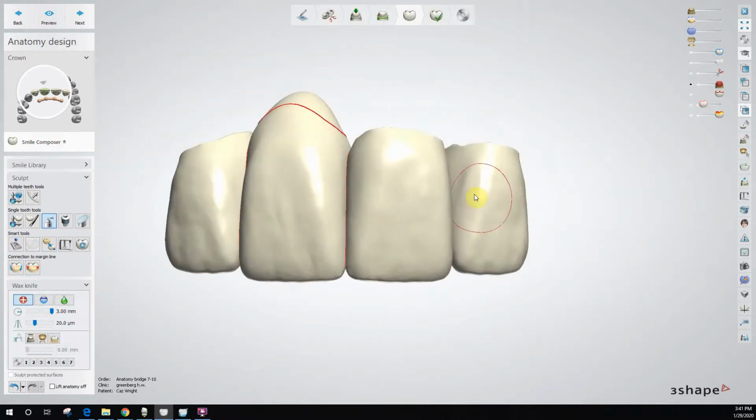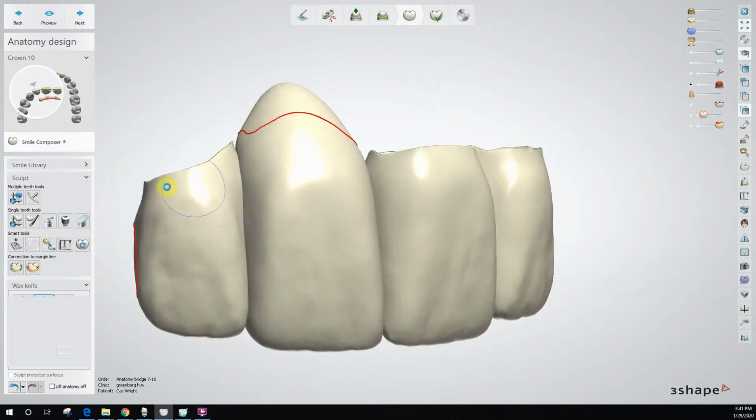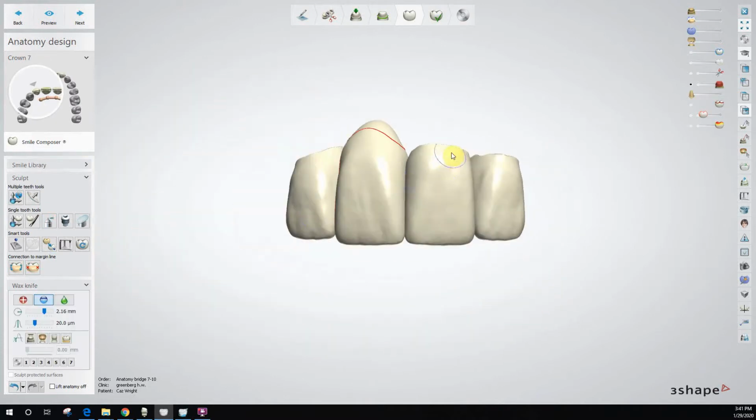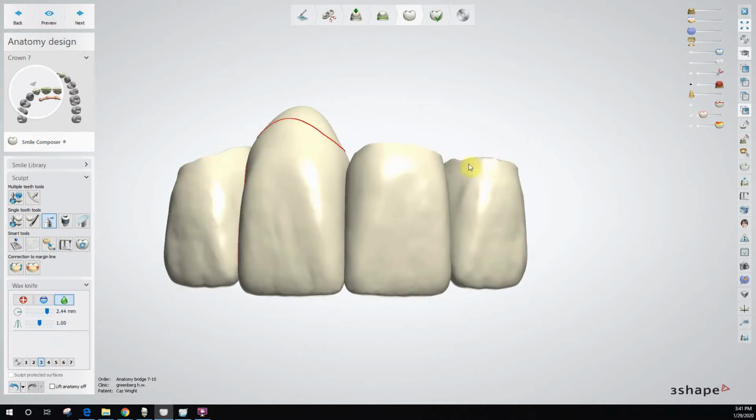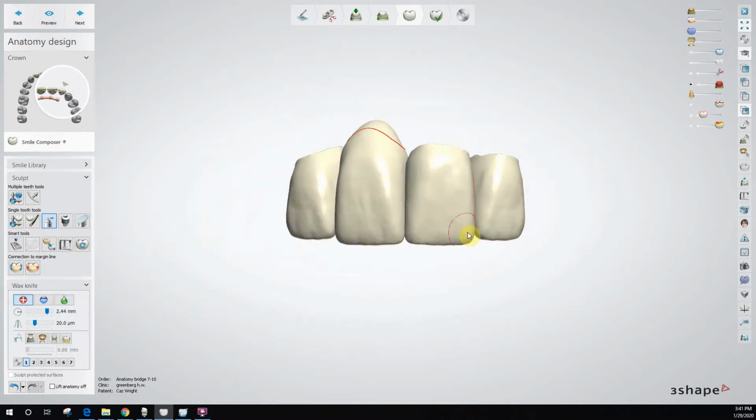Okay, so we'll go to G2, I'm going to take just a hair off right there, a little off right there. Okay. 3 is smoothing, smoothing things out. 1, add just a little bit back. I'm just kind of using this as an example.